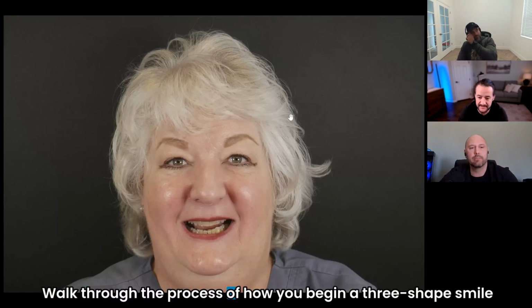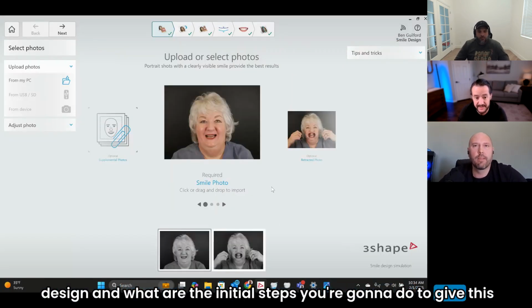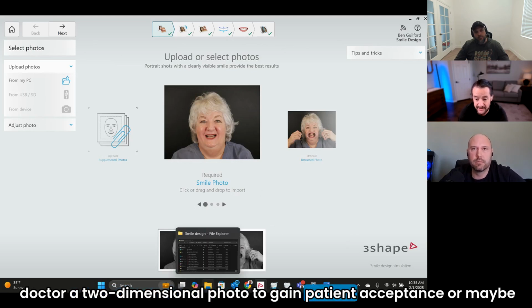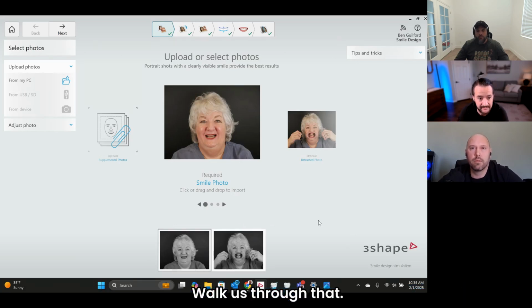Walk us through the process of how you begin 3Shape smile design, and what are the initial steps you're going to do to give this doctor a two-dimensional photo to gain patient acceptance, or maybe it's patient excitement to accept the case and move forward with treatment. Walk us through that. Sure.